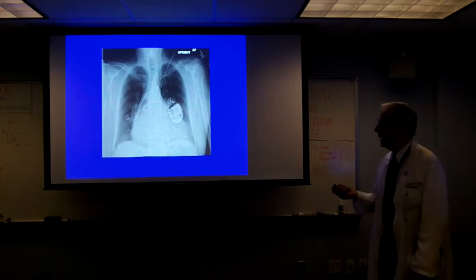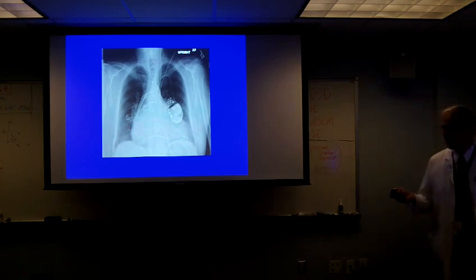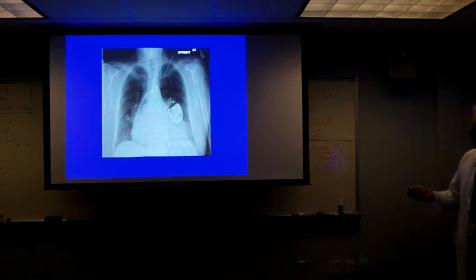So after you verify that it is indeed the same patient, you know that this person had a heart transplant, because the valve can be replaced, but it doesn't disappear altogether. Take that back.